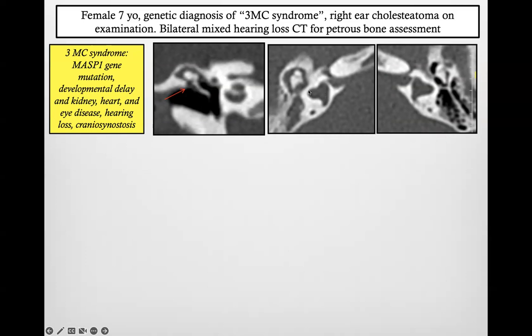The vestibule continues in this bulbous lateral semicircular canal, which we call persistent anlage of the lateral semicircular canal, meaning that we don't have a bony island formed, and we just have the lateral semicircular canal completely fused. So when you read in the report, persistent anlage of the semicircular canal is this appearance here where the semicircular canal failed to form and to detach with a properly formed bony island from the vestibule.